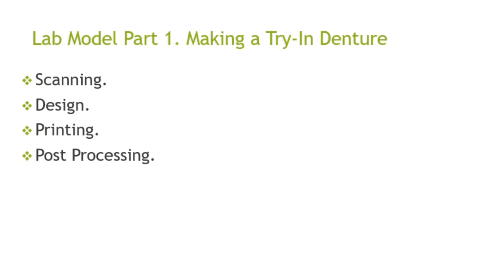Now let's take a look at the manufacture process itself, starting with scanning. The following scanning video is done based on the DOF scanner. However, the scanning process is generally the same for any laboratory scanner. So this should serve as a pretty good guideline of what to do whenever you receive physical records, regardless of what scanner you currently have.